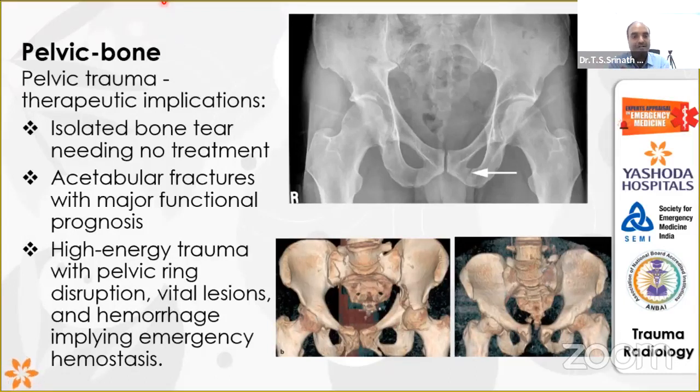When you see such things on an X-ray, you see here, there are multiple fractures. See here, there are multiple fractures. All the fragments, there's a fracture. So these are the indications for your CT scan. Anytime you see two projections perpendicular to each other showing extremity trauma, then CT imaging is a must in the acute trauma setting itself, so that it gives you an idea what kind of injury is there and what exactly the procedure is to be done for the patient. Next slide, please.